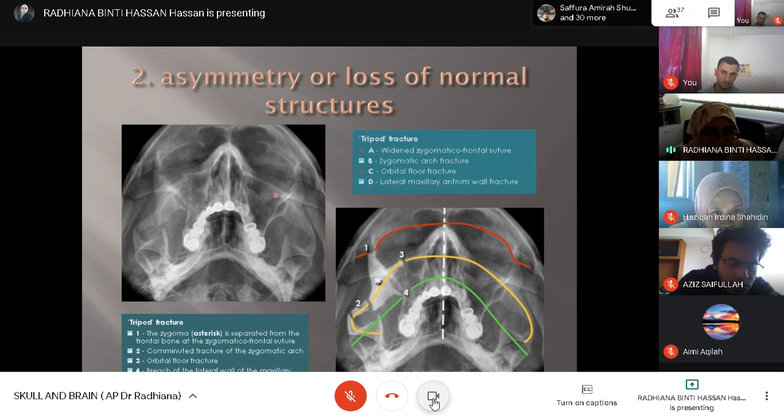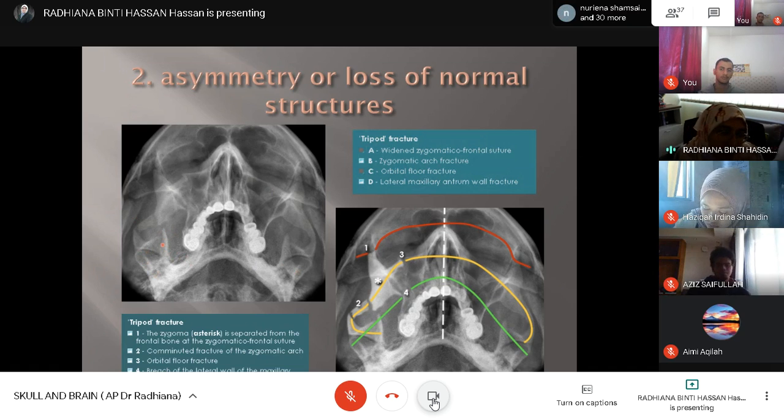And then go to the inferior orbital rim on the other side, where you can see very smooth lines, continuous, and also now the head of the elephant, the other side, the zygomatic arch is also smooth, and the trunk you can see is very smooth compared to the other one. Now you see the mandibles. So mandible, important for you to see two of the processes here.